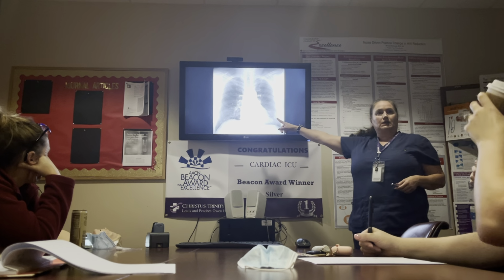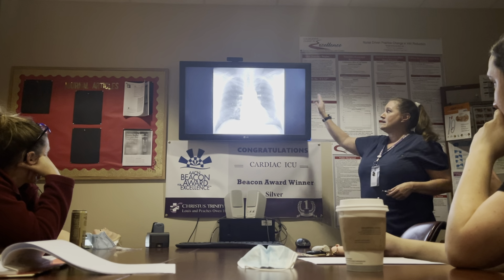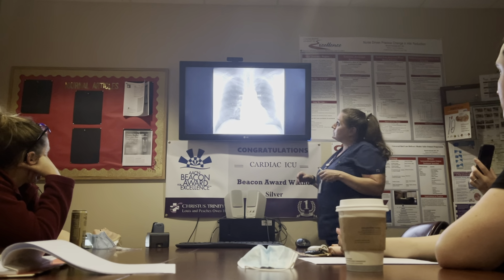So that's sternal plating. Same kind of principle, it's just pulling it all together to make sure that it stays stable and stationary.